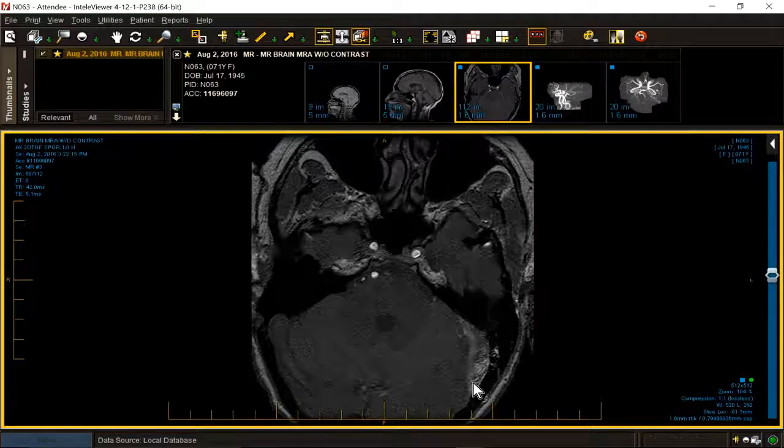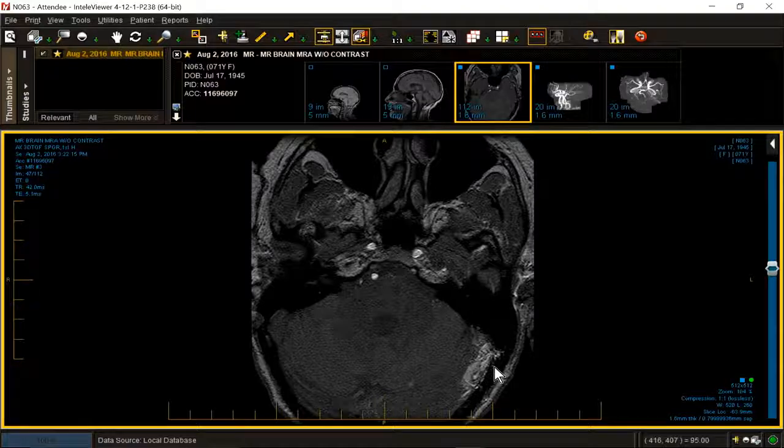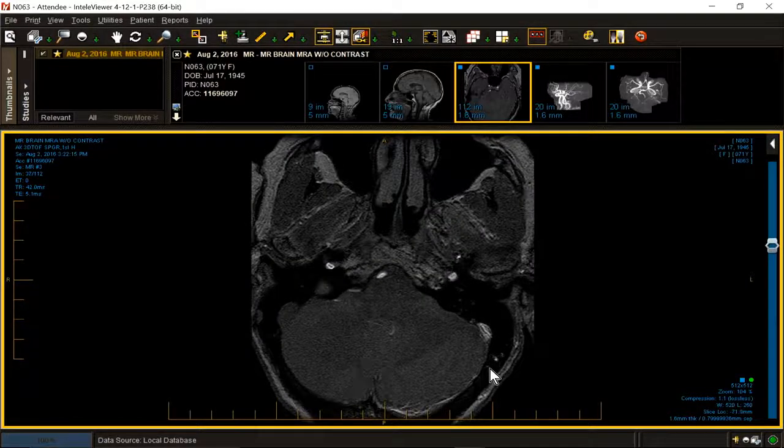Let's scroll this one. I have it up. And I think there is venous ectasia in this case when you compare side to side. There is some cortical venous drainage. The direction of flow in earnest is hard to ascertain unless you have a more dynamic assessment of this patient.